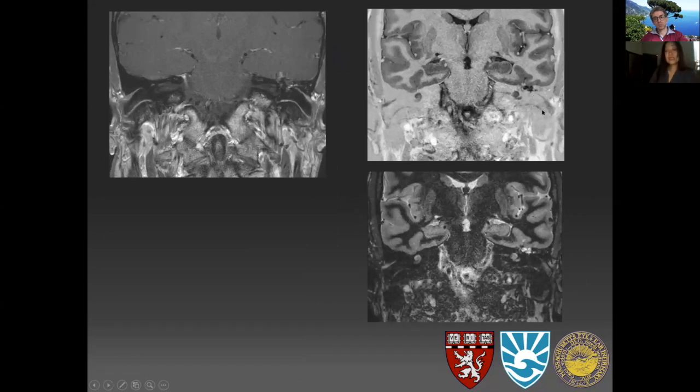So we do these inversion recovery sequences, double inversion recovery. Some of our techs are on this call, and they know it's reflex. When we're looking for encephaloceles, we would run these sequences. So you can see on top, the fluid is black. So the black is great. It stands out really nicely away from brain parenchyma, so we can tell there's no brain in there.